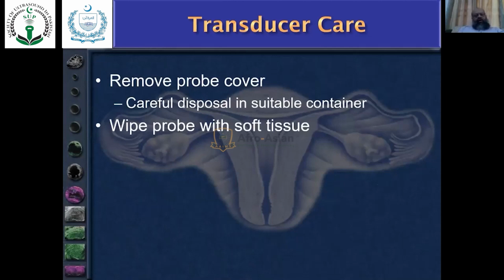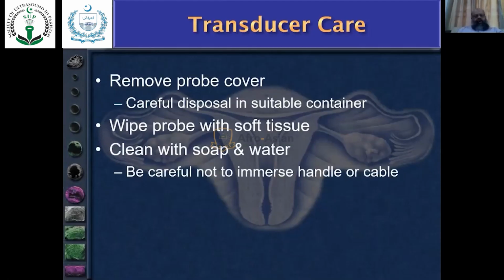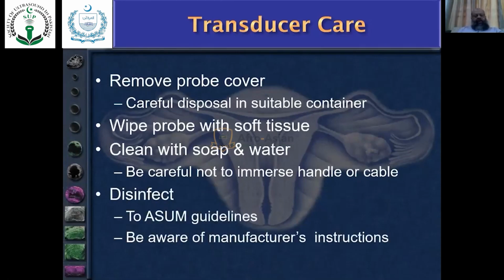Remove the transducer cover. Careful disposal is in a suitable container, which is a dustbin. Wipe probe with soft tissue. Clean with soap and water. Be careful not to immerse handle or cable. Disinfect according to AIUM or ASUM guidelines, which are the guidelines of the American Institute of Ultrasound in Medicine or Australasian Society for Ultrasound in Medicine.